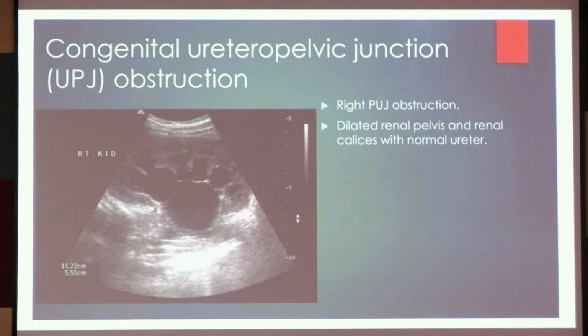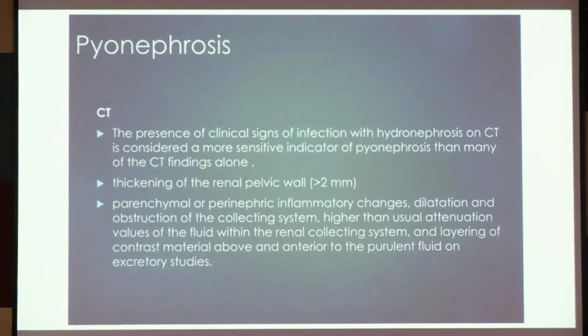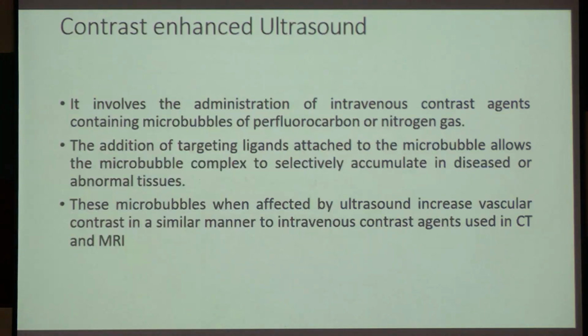Okay, so pyonephrosis was done. Now today I am not going to have more theory. It is all going to be pictorial presentations, with the reference for it. I just wanted to show you that we know CT scan has contrast, MRI has contrast, X-ray also has contrast, but we should also know, which is a favorite question of the examiners, does ultrasound have contrast? It actually does have a contrast.